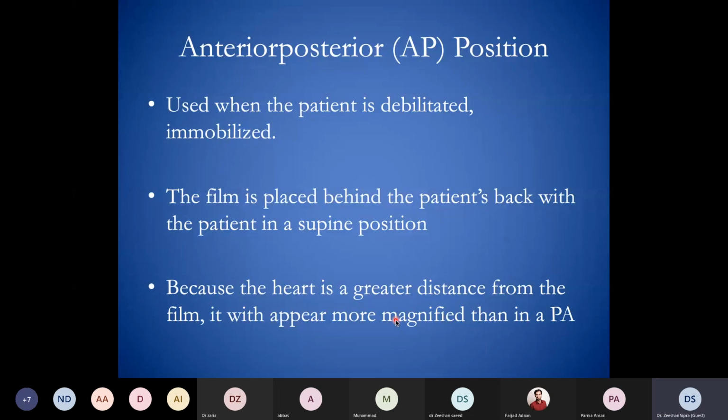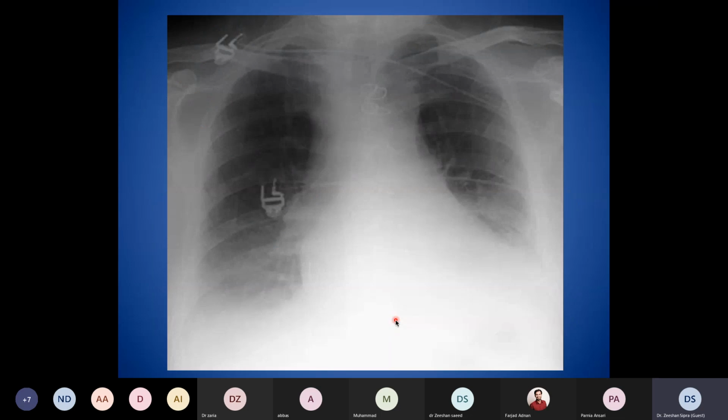Roughly that was the posterior border, ventricle and atrium. I would move with the AP view. AP view, this is the view we usually obtain in an ICU setting. For example, we can appreciate these are the chest leads. There are the sternotomy sutures over here that suggest this patient had an open heart surgery.